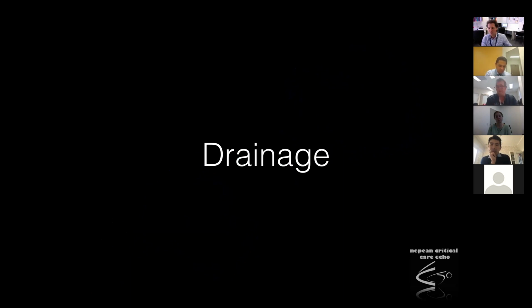So how do you use echo to help guide drainage? Ray, take us through this one. Do you use echo to guide your drainage of these things? No, I don't. But I would use subcostal view, and my approach would be a subxiphoid approach. Yep. And I obviously do it in plane with a needle.